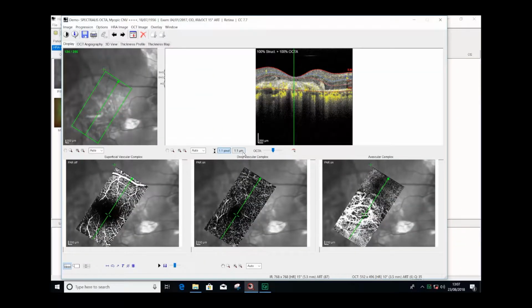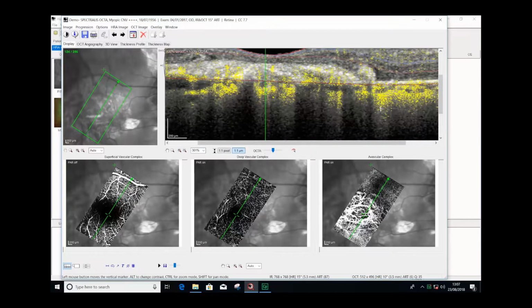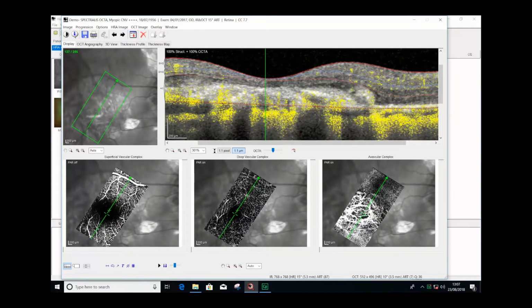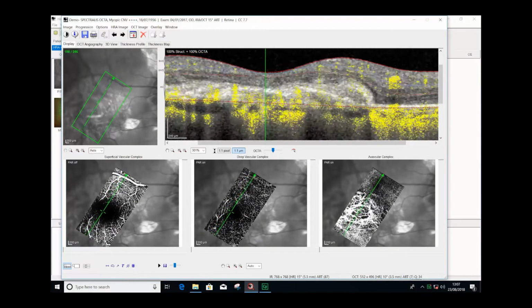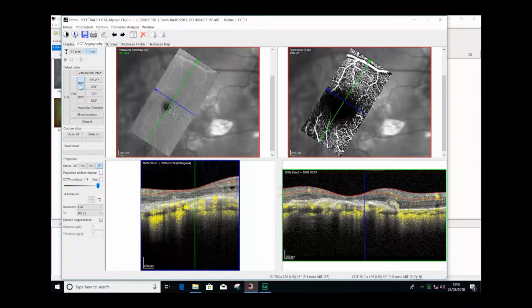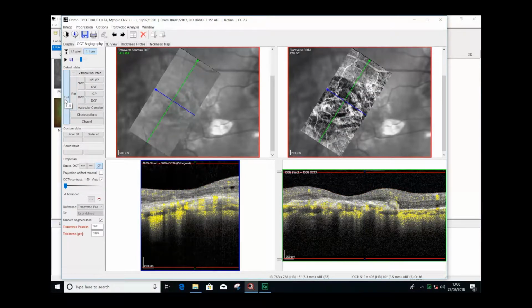The OCT angiography again shows a clearly defined vascular lesion in the avascular complex. Moving the B-scan across this region allows us to identify flow within the area of subretinal hyperreflective material. Taking our systematic approach to evaluating OCT images, looking at the retinal segmentation again shows an area of subretinal choroidal neovascularization, which again is demonstrated on the full and the retinal segmentation.